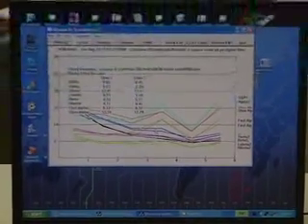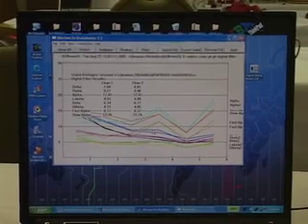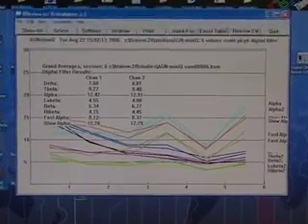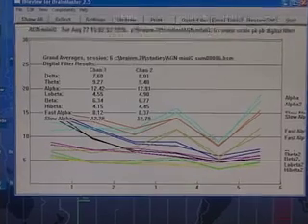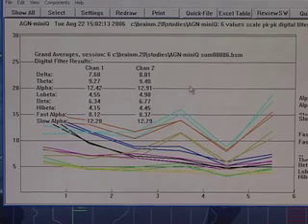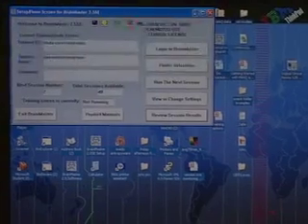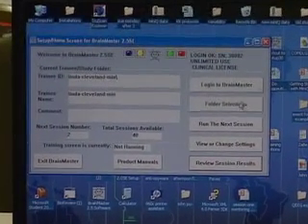And this is a recording that was done with a mini-Q using my settings. And first, let's see, how did I get the settings for this recording? How can you set up your original file so you can do a recording that will look like this? So what we'll do is I will show you how to do that. So I'm going to minimize this, and we're going to go back to the basic BrainMaster page, okay? And let's set up for a mini-Q file.